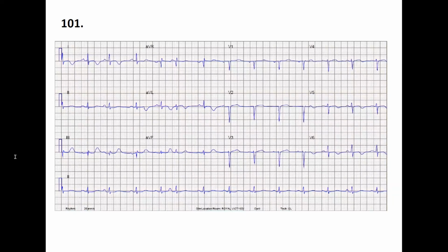because... Okay, wait. Before you jump to the end, let's start from the beginning. All the time we will start with rhythmicity. Is it rhythmic or not? This kind of tracing that you have usually includes a rhythm strip at the bottom, maybe one or two, all right? Now, by looking at this long strip, you can judge whether it is rhythmic or not. Is it rhythmic? I do not know, because if you compare the distance, you can see... No, sorry. I meant it's not rhythmic. It's irregular, so it's not rhythmic.